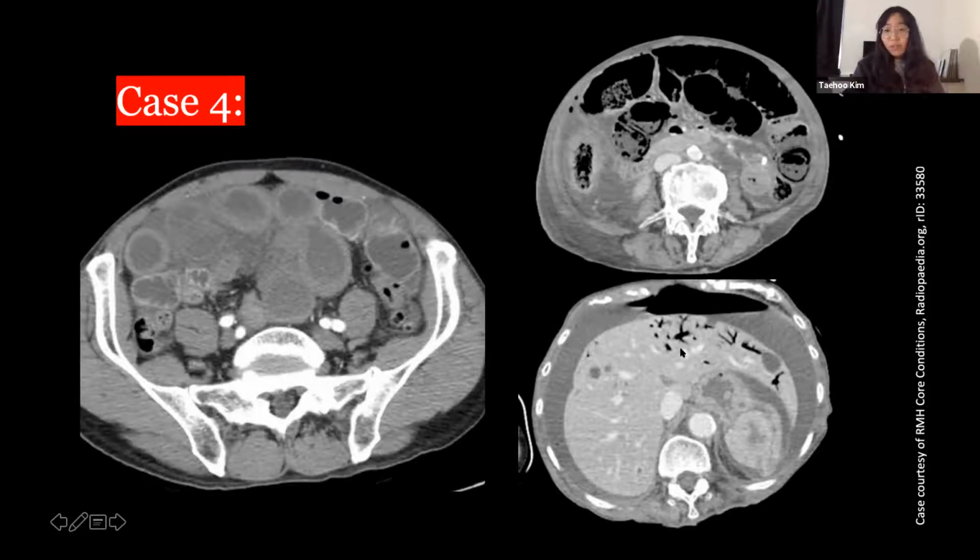The way to differentiate between portal venous gas, which is a more urgent sign, compared to pneumobilia, which is air within the biliary tree, is that portal venous gas is more peripheral. It extends all the way to the margin of the liver, whereas pneumobilia, which is most often seen post ERCP, like stenting, which is a normal finding, would be closer to the hilum around here. So good job.